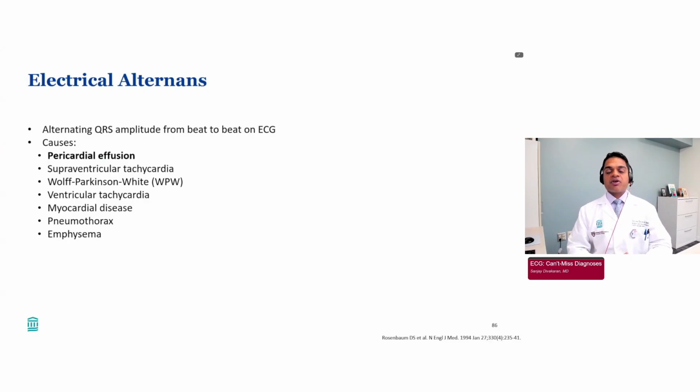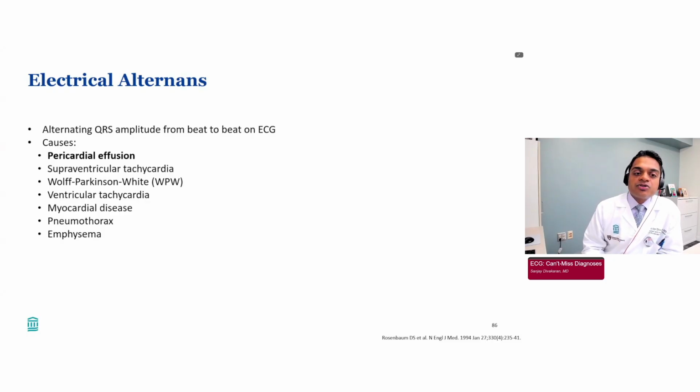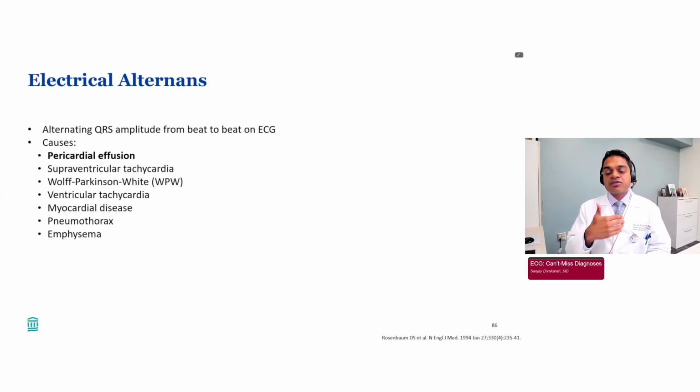And a common cause is pericardial effusion, as in this patient, but there are other causes, including both supraventricular and ventricular tachycardias. And then in our cardiology service, patients with advanced heart disease can have this. It's basically a myopathic process in patients with end stage cardiomyopathy.